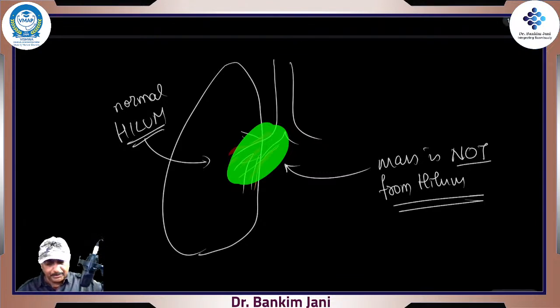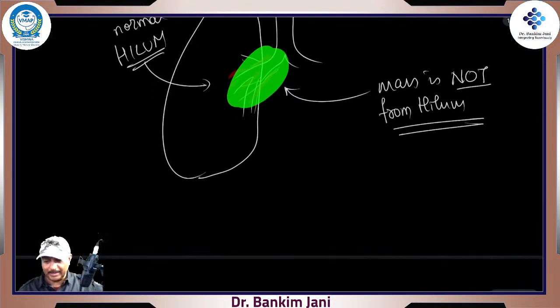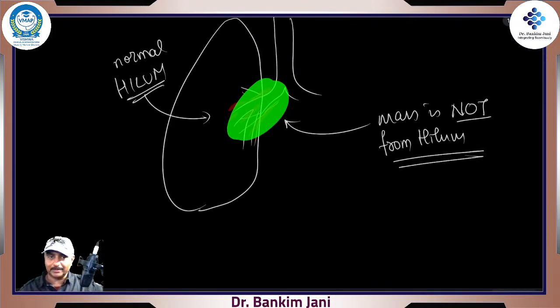When you see this thing, this is like a small cheat. So benign, that's right. It could be malignant too, but initially the chances of benign are more. So the mass is not from the hilum.